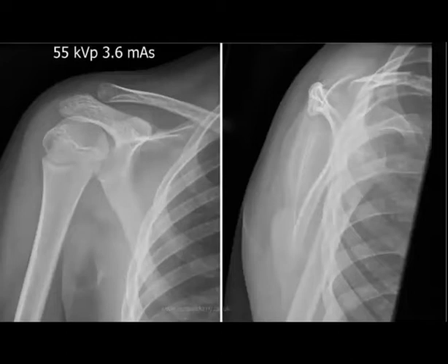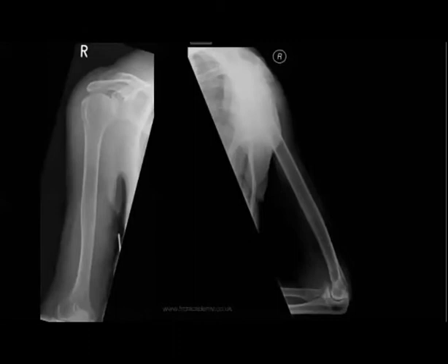Nermeen, revise again, please. Ala. Yeah, it is a fracture, but where? Maybe. Yeah, I understand that maybe. Yeah, Ala, perfect. Yeah, clavicle. This is the clavicle. So this is a fracture, but it is not in the... So 10 big flowers for Ala and Nermeen. Okay.